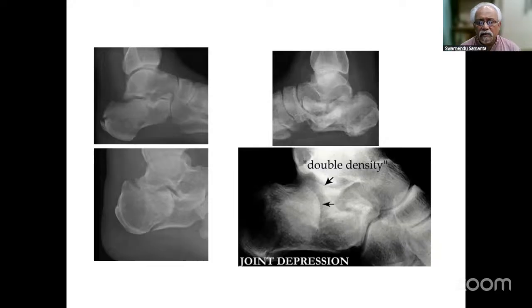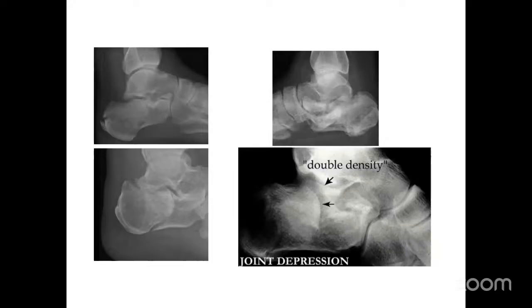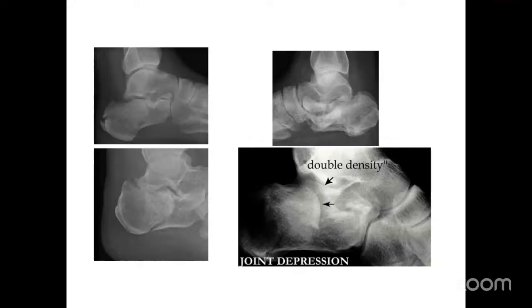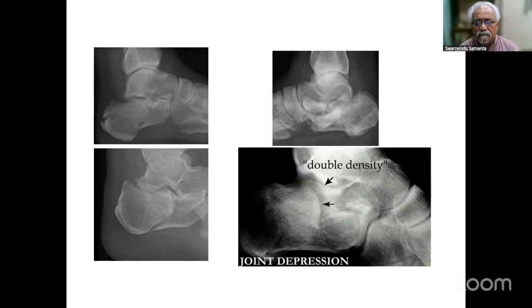Can anybody volunteer for this X-ray? This radiograph, just tell me. It is a tongue type fracture of the calcaneum. Yes, tongue type.